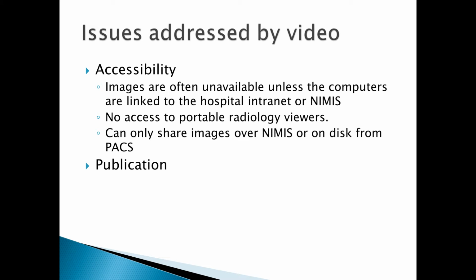This may have particular value in settings where images are unavailable off-site, where there is no access to portable viewers, or where there is rapid, clear communication required between sites without a dedicated online sharing facility. It also provides another medium for publication with incredible scope for growth and exposure. This is likely to be an expanding feature for academic publications, like for example the Colorectal Disease YouTube channel.